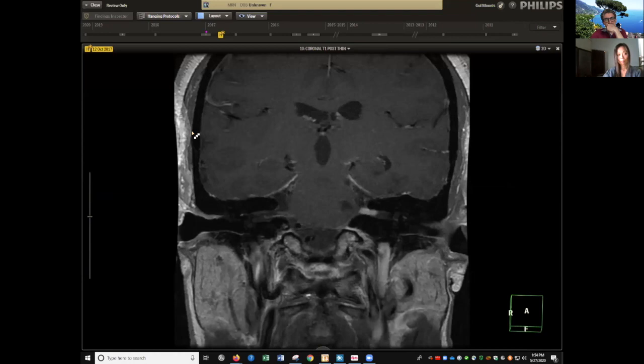And is it symptomatic, Kelly, or is it incidental? Yeah, absolutely. Conductive hearing loss, very easy to miss if you rely on axial images. So that really highlights the importance of looking for the entirety of the incus on coronal images. Exactly, coronal or sagittal, yep.